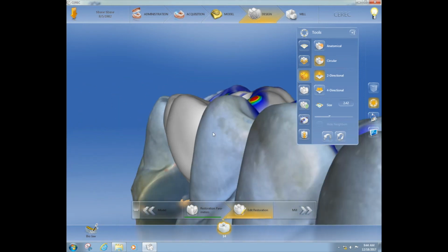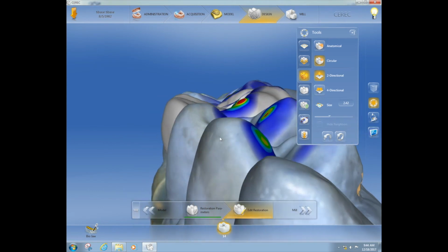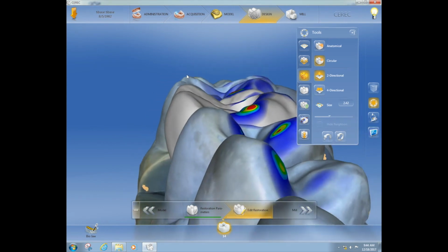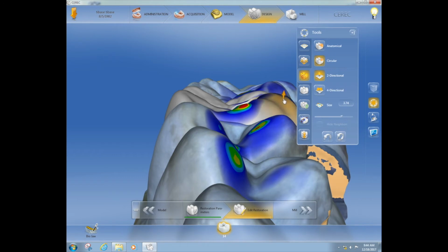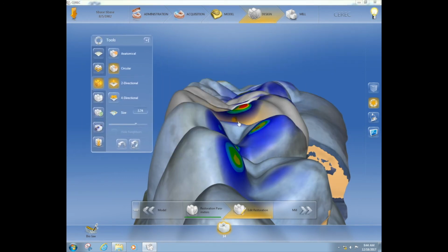Well, it doesn't exist yet in the system, but right now I'm just kind of looking at the contour, the shape of everything. And so I might bring that down a little bit. So it just makes sense. You're going to design the crown first and then tell it to split and make the abutment. So I'm just getting all that prepared.